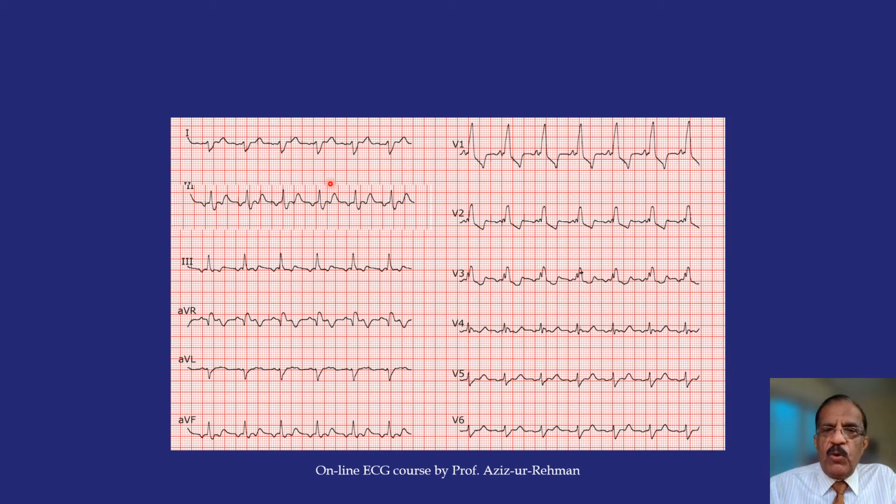Another ECG, what do you think? I think it would be slightly difficult. You know, here you may pass it like normal. You see, this is, you might not pick up the problem. I will magnify it and I'm sure then you will pick it up. Okay, let's do some effort.